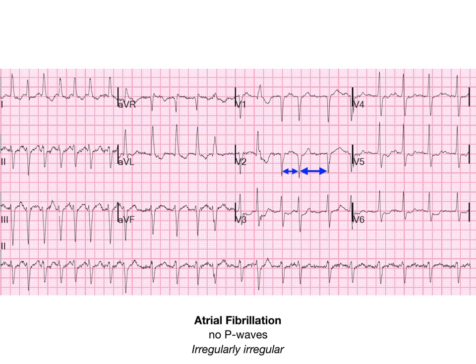Okay, so this is AFib, very, very high yield because they can get into pharmacology, they can talk about rate control, they can talk about rhythm control, they can talk about hemodynamic changes and pathophysiology, but you have to be able to recognize an irregularly irregular ECG with no P waves. So again, rate, rhythm, axis, that doesn't get you anywhere. The question is, are there P waves and is this sinus? In this case, the answer is no.